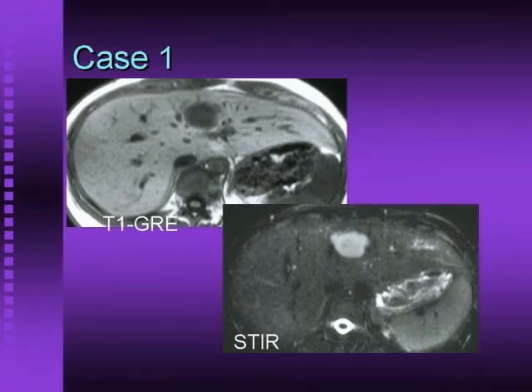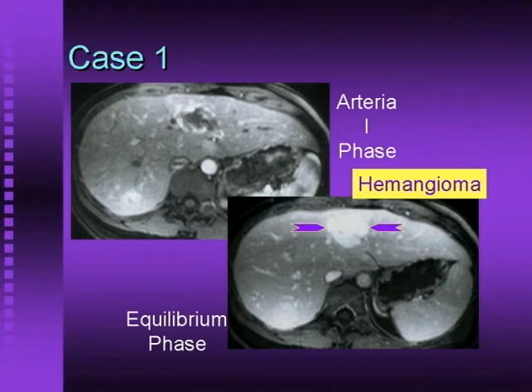The lesion is hyperintense on the T2 weighted acquisition, which is not a very specific finding, and so we tend to rely on contrast enhancement to characterize the lesion. In this case, we have a very classic appearance, marked enhancement in the arterial phase and the peripheral portion of the lesion in a nodular pattern, a broken ring pattern, and then over time, this lesion fully enhances. And I think all of us in the room would feel very comfortable with the diagnosis here of a hemangioma.